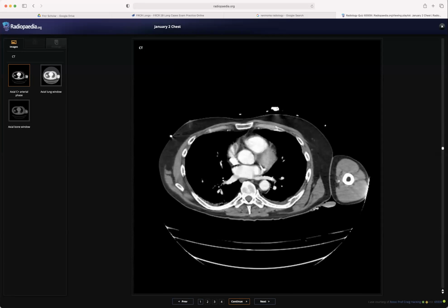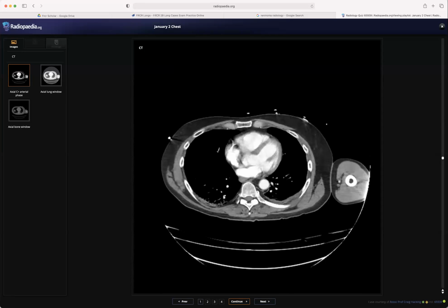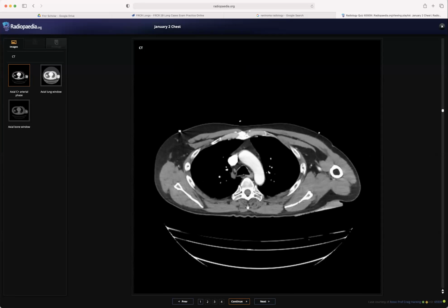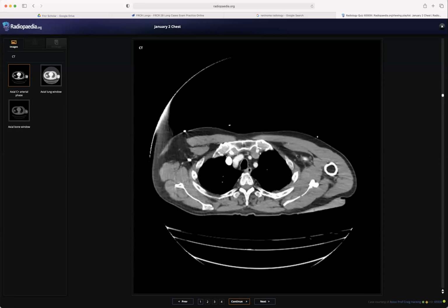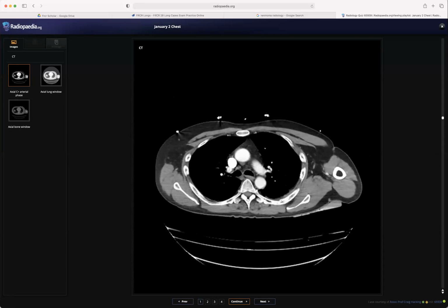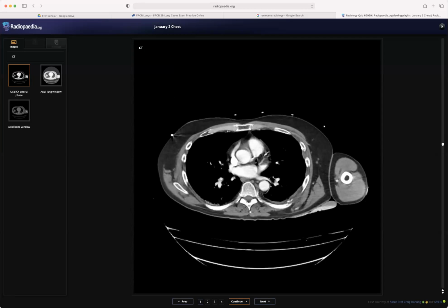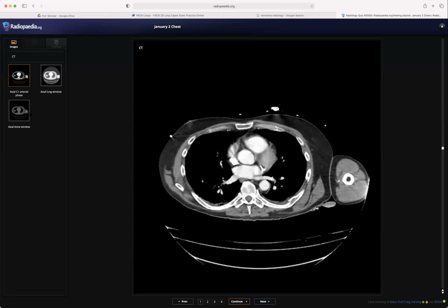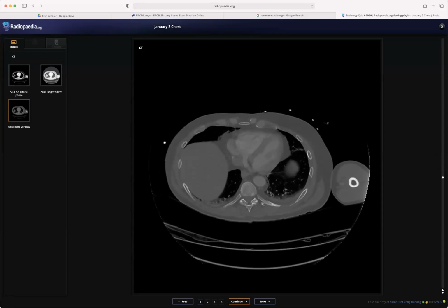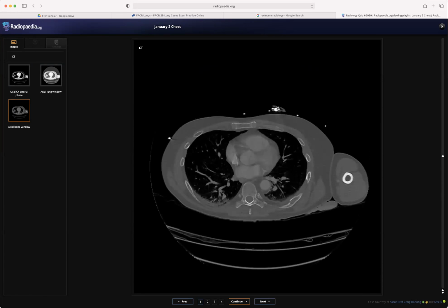And there is the upper rib on the right side showing a fracture, with a fragment that's displaced inside, which is probably lacerating the lung and pleura. I would like to look at the bone window as well as the lung window for better appreciation of the fractures, and also to look for any pneumothorax or lung contusion.